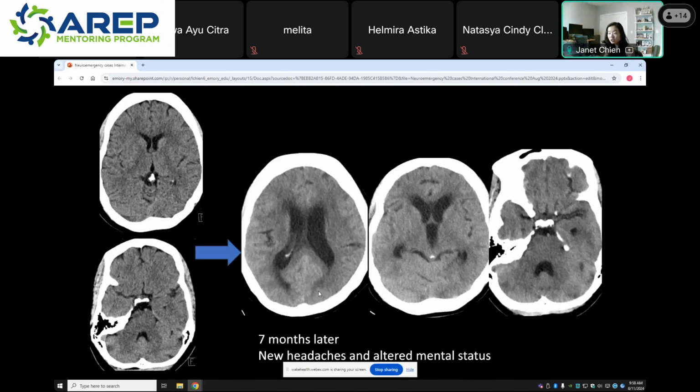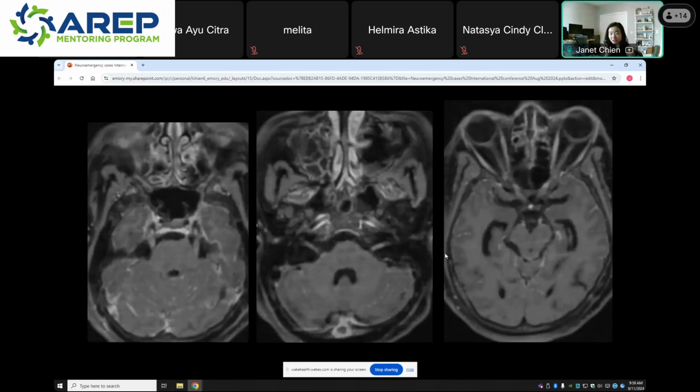Communicating, awesome. The reason why it's communicating is because all of the ventricular system is dilated, right? Your lateral ventricles are dilated, your third ventricle is dilated, your fourth ventricle is dilated. So there's obstruction at the level of arachnoid granulations and CSF absorption. So what do you think is causing her communicating hydrocephalus? I will tell you there's no ventricular hemorrhage. She is not presenting infectious. She's not febrile. Awesome, leptomeningeal metastases, great job.